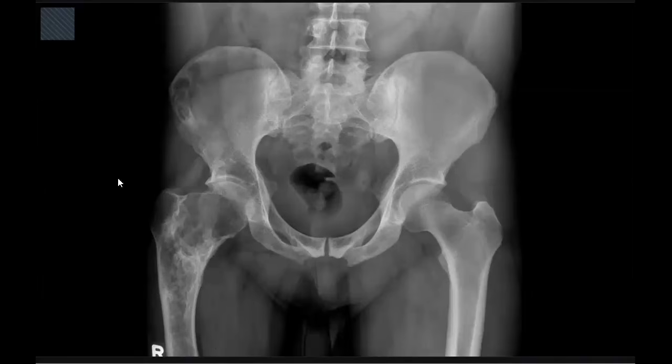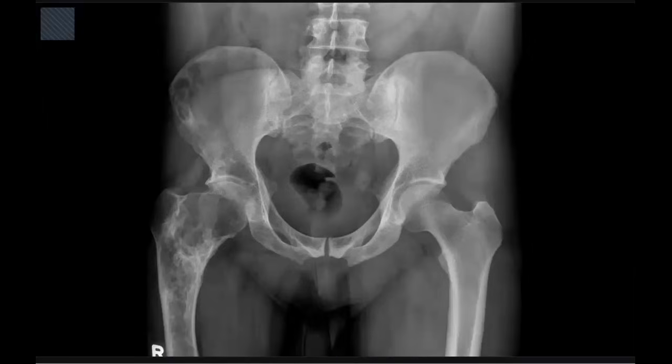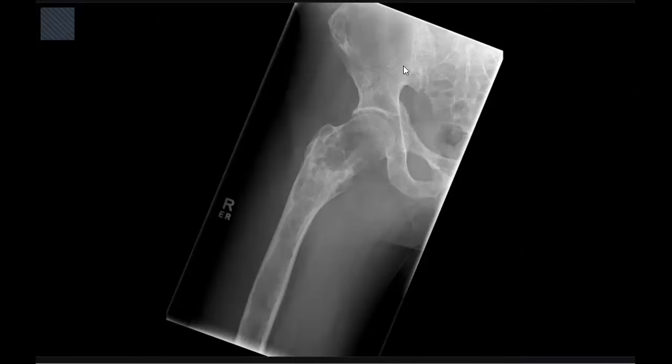You have to make a full radiograph of the limb, and you should always ask for the other orthogonal view, because in plain radiograph we always do two views, one AP and one lateral or oblique. So there are expansile bone lesions in long bones and iliac bones, likely polyostotic fibrous dysplasia, with another secondary lesion.